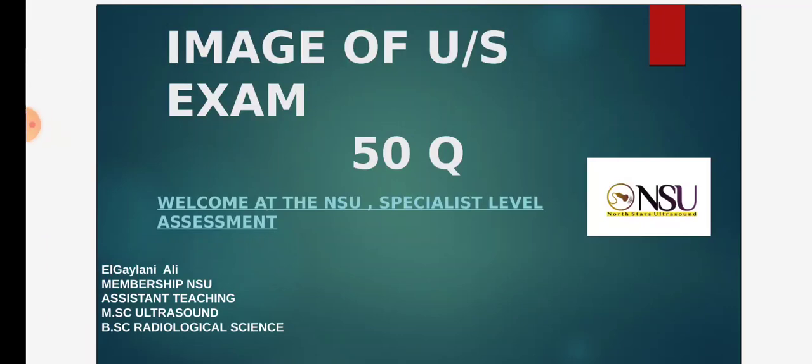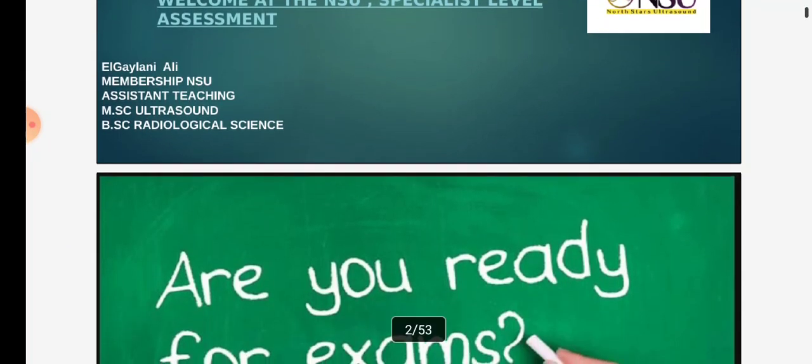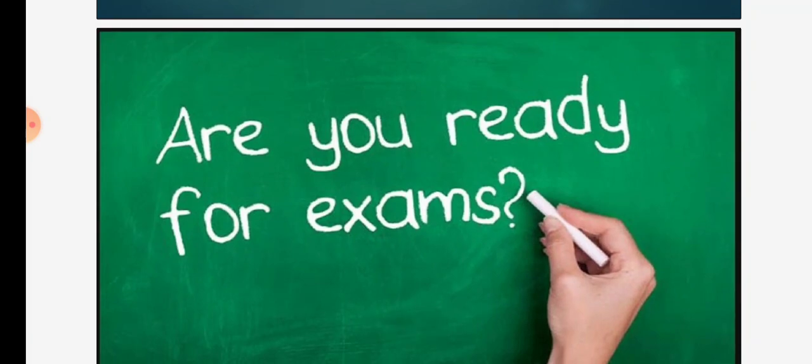Today I will present the specialist level assessment. My name is Elgaylani Ali, a member of North Star Ultrasound. I will present 50 images. Are you ready for the exam?